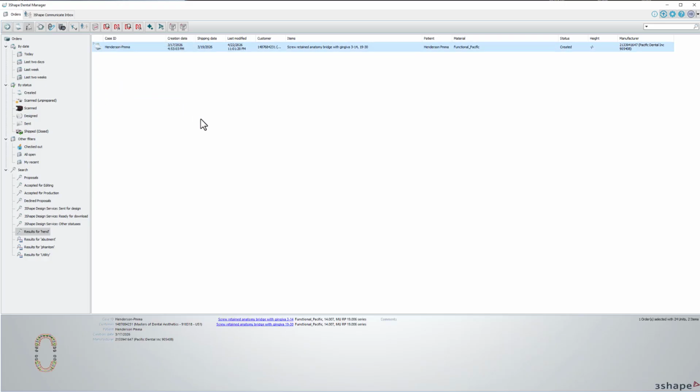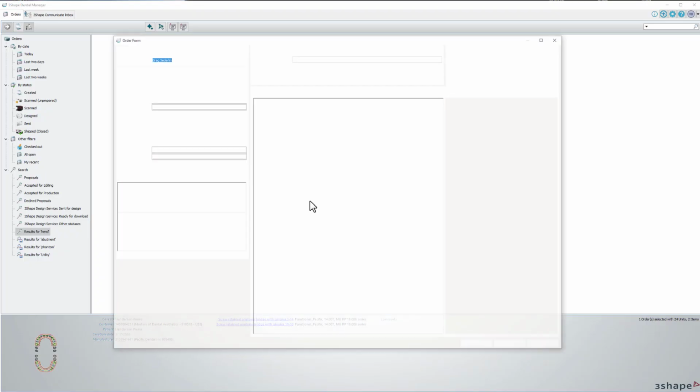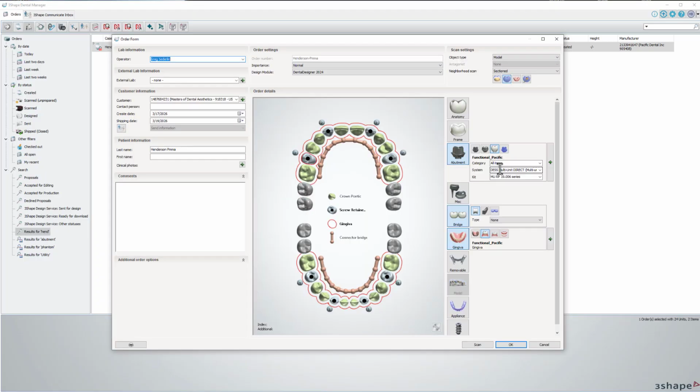Actually, let's modify this so you can see what the actual order is set up for. So now this is where you want to take the time. This is DES MUA Direct 2, RP. We have those things. We have our bridge setup, Pontics, tissue, bridge form, upper, lower, and again, 4, 7, 10, 13. That's what was scanned in Icam. That's what was scanned in, created in the other order. That's what's created in the final. We have the pre-ops, which we're going to bring in the aligned conversion, upper and lower, and then again for the lower. So this is the order. This is the final order that's set.